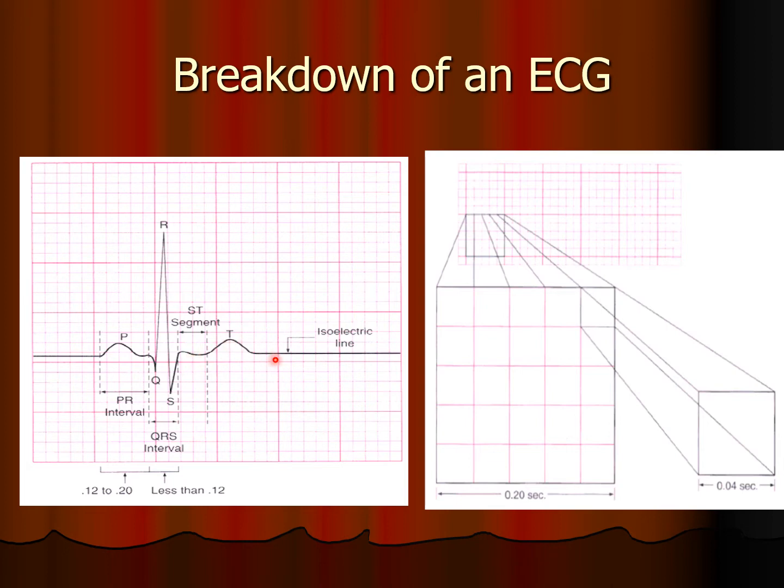And then we have a T wave. And this is the resting time for the ventricles. This is the absolute resting time of the ventricles.